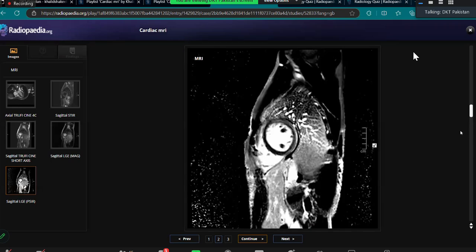Sarcoidosis can also lead to myocarditis and myopericarditis as well, but in that there is patchy enhancement rather than this kind of enhancement. And there are also multiple other things. If you are suspecting sarcoidosis, you need to look at the axial images for any mediastinal lymph nodes and things like that. Before giving a diagnosis of sarcoidosis, if there is a clinical known history of sarcoidosis, I would like to look at the mediastinal window for any enlarged mediastinal lymph nodes.